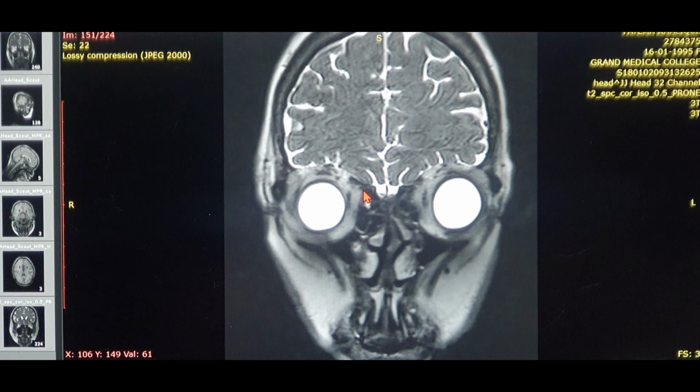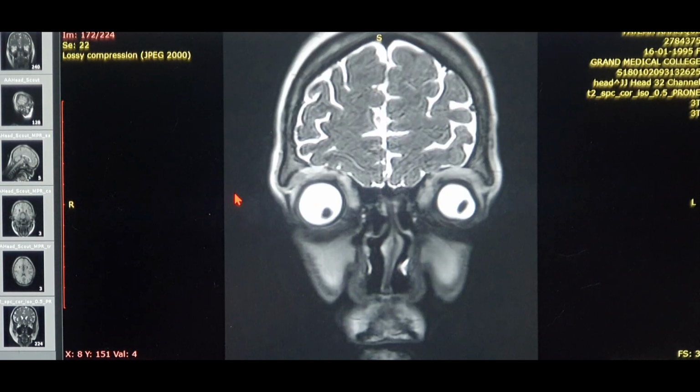So anyways, I'm going to help you read the MR cisternography. You're supposed to go from the extreme anterior aspect to the posterior aspect. So this is the frontal sinus, as I spoke some time back. That's the frontal lobe. That's the right and the left cerebral hemisphere. That actually is the skull. That is the cranial vault, and this is nothing but the subcutaneous tissue in the scalp, which is completely different from what you see on the CT scan.